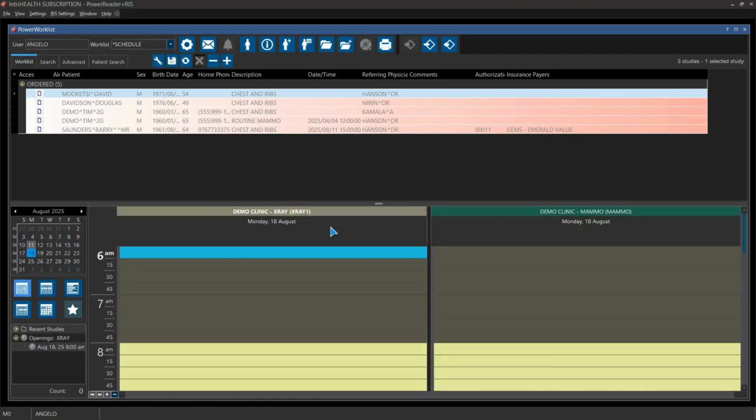Okay, so going back to our daily view, here we have some settings to adjust the time scale. Currently it's set to 15 minutes, so that every entry is separated at 15 minutes. You can change that from 5 to 30 minutes. We can also jump to a particular date, or if I'm already on a different date, I can click on today, which will bring me back to today's date. Additionally, if you'd like to see an additional month ahead, you can simply drag this window downwards, which will open up the next month for you to view as well.